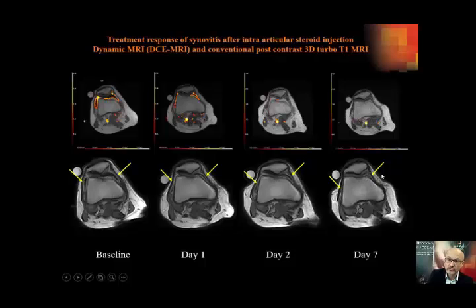And usually the synovial lining is not visible in a normal subject, so this will always also correspond to a static score degree of 1. But you see on the upper right that the perfusion has been shut down as expected from a treatment effect, because the patient on day 2 had reduced or almost diminished symptoms. And it's not an artifact, as you can see, because you have the vessels behind the knee joint that should always stay open on a physiological level as your reference.